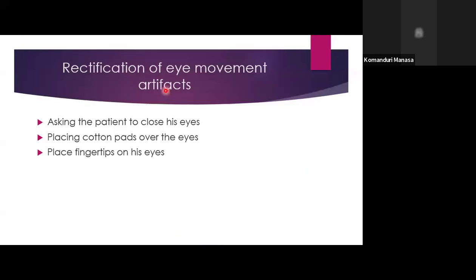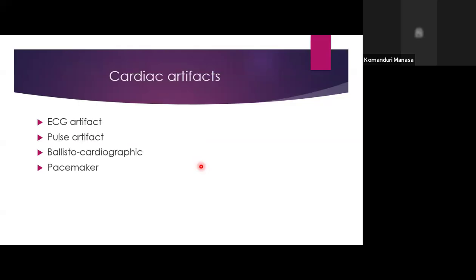For rectification of eye movement artifacts, we can ask the patient to close his eyes, placing a cotton pad over the eyes or placing fingertips. The cardiac artifacts can be ECG artifacts, pulse artifacts, ballistocardiogram, or pacemaker artifact.